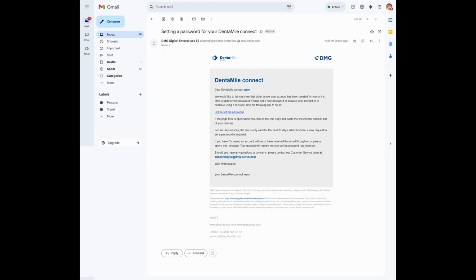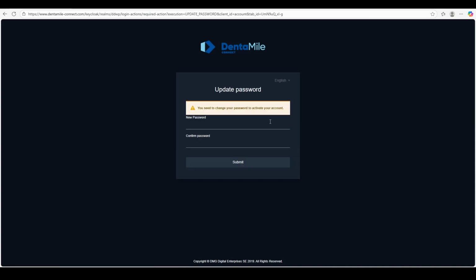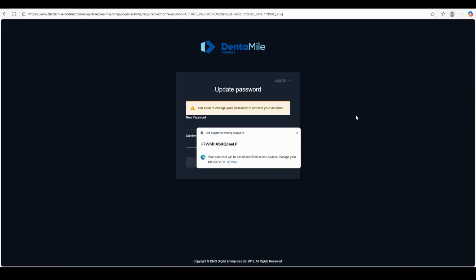Once accepted, the practice will receive an additional email with a link to set up their creator account. If this email doesn't arrive in the main inbox, check the spam folder. To set up your creator account, first follow the link to reset your password.